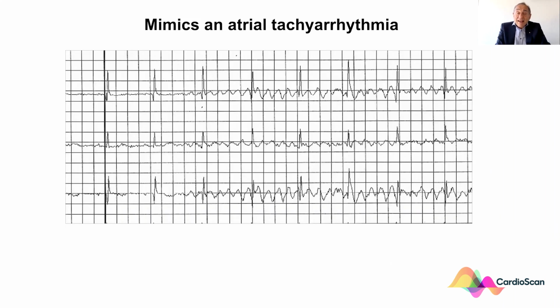Here's another atrial tachyarrhythmia. Again, remember, look at all the leads, look at all the tracing, and you can see that the QRS complexes move through the whole tracing, and it is all regular. So this is clearly and obviously an artifact mimicking an atrial tachyarrhythmia.